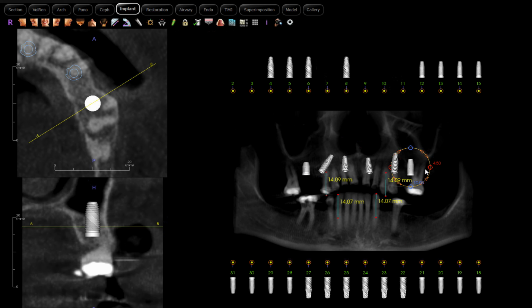Now, could we do a traditional all-on-4 here and just angle both sides? Absolutely. This is a relatively younger patient. She's in her 50s. So I would like to give more options long-term. If she does lose one of these implants or has issues, it would be nice to have 6 in the arch. So that'll be the idea there.